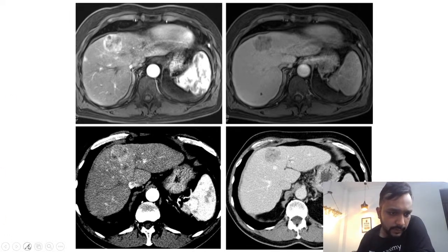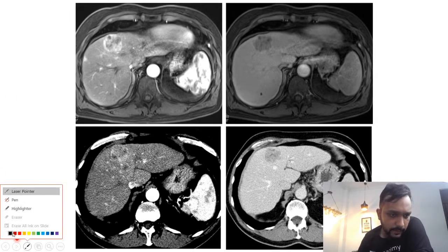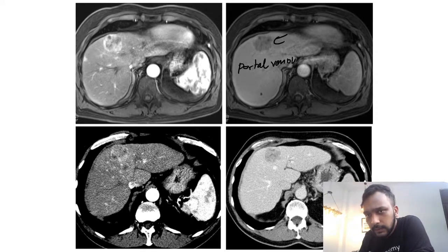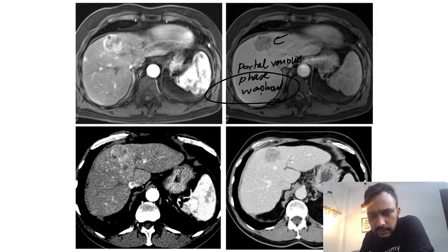So, guys, in this image, we can see that this lesion is showing portal venous phase washout.